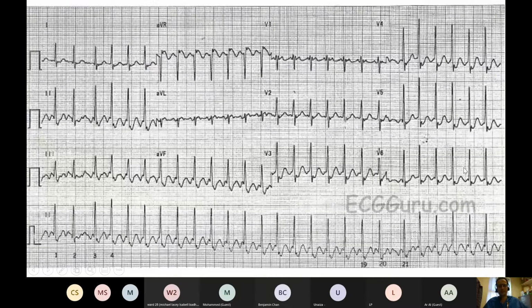What about this ECG? I was very disappointed when I was preparing this presentation because I saw somebody with a beautiful ECG like this just last week, and unfortunately I didn't take a photo of it. So I've had to poach one off the internet. So what does this ECG show?